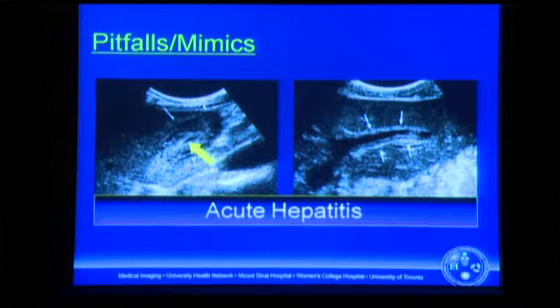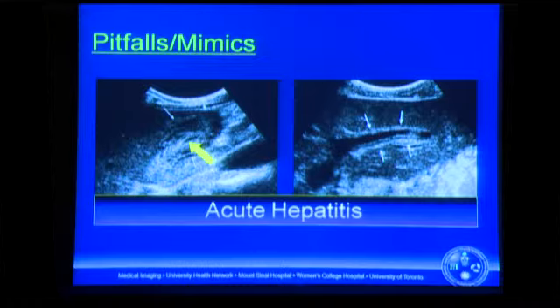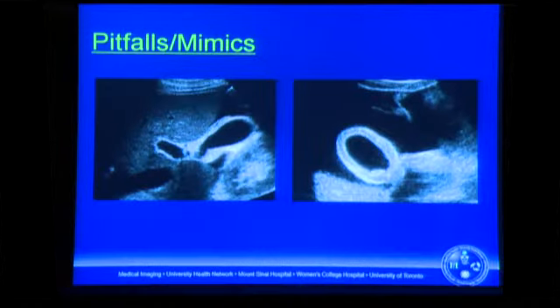So if you misinterpret this as acute cholecystitis, you're probably putting this patient at some risk of further liver injury from the anesthetic agents. So again, know your patient, look in the chart, you realize the transaminases are up in the thousands, and you can confidently suggest that the diagnosis, or at least that the appearances, are in keeping with the diagnosis of acute hepatitis.